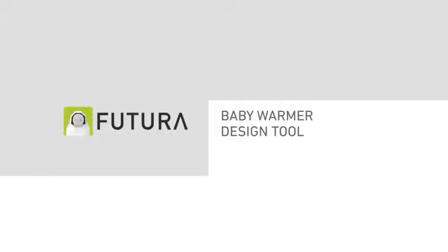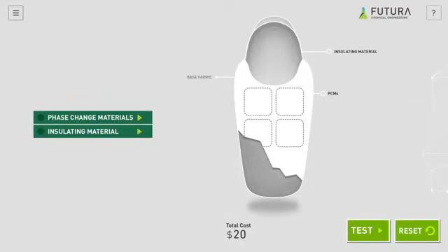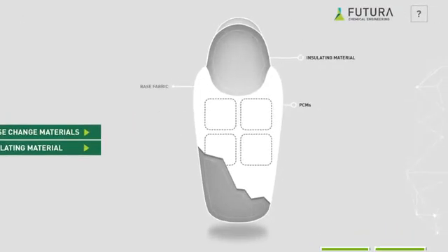Welcome to the BabyWarmer design tool. This is where you build your design. On the right side, you can see a diagram of the incubator. It's like a sleeping bag.